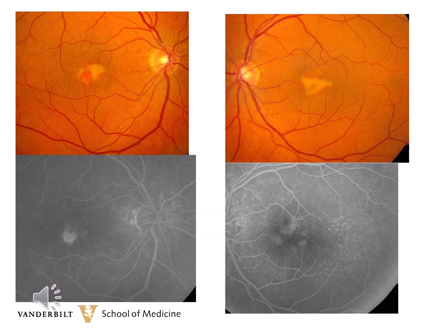We've seen this gentleman on several occasions already, but I wanted to show him at this point to show the pattern of fluorescein angiography. The right eye has a central area of hyperfluorescence, and this is related to the area of RPE atrophy where the vitelliform lesion has absorbed. But note the left eye. Again, here's the typical pattern of the dark center with hypofluorescent spokes, and in between are areas of hyperfluorescence. Again, this is very, very typical of pattern dystrophy. Also note you can see the drusen temporally in the left eye.